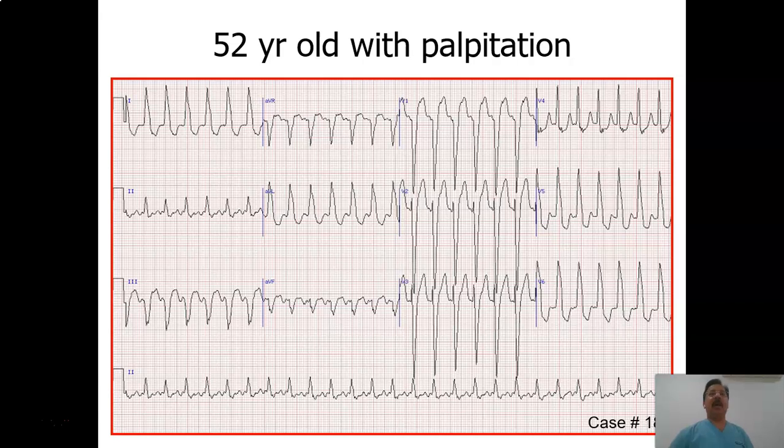And also, if you get ST segment depression in V1, V2 and V3, this is again a criterion that the patient has myocardial infarction in the presence of left bundle branch block. Or if the ST segment elevation is very tall, more than 5 mm, then this carries the 2 points or the weakest evidence. Here there is ST segment elevation of quite far more than 5 mm, but alone this is not sufficient to diagnose MI in the presence of left bundle branch block. So there is probably no MI in this ECG.